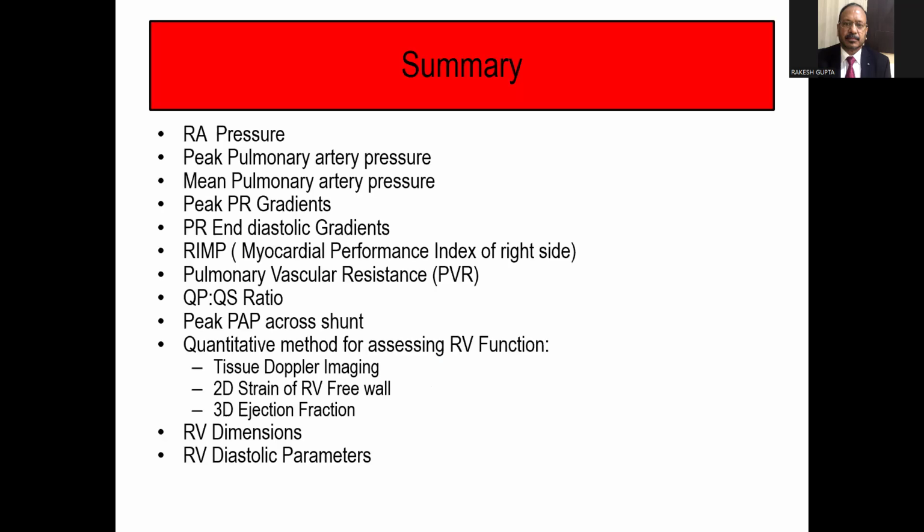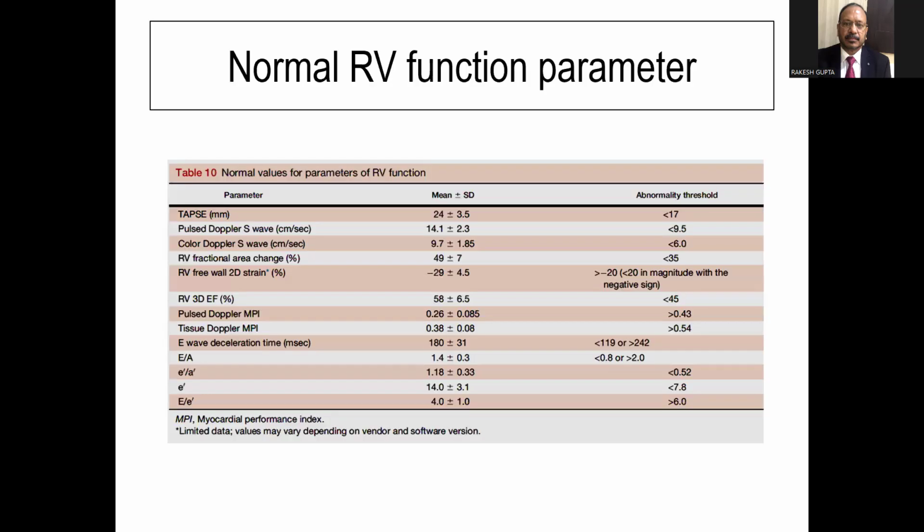In summary, this is what we look at, and I'm sure many of you will feel very abnormal looking at this subset of investigations.